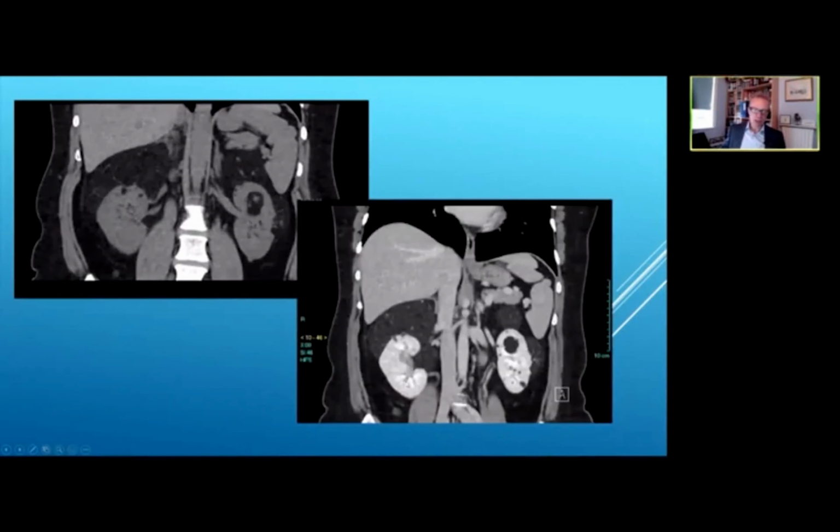The more sharp-eyed amongst you, who should have been radiologists, will see the large AML around the cortex here. Same on the left-hand side. And the clue to this being an AML and not a liposarcoma is the notch in the renal cortex that shows that this has got a renal origin to it.